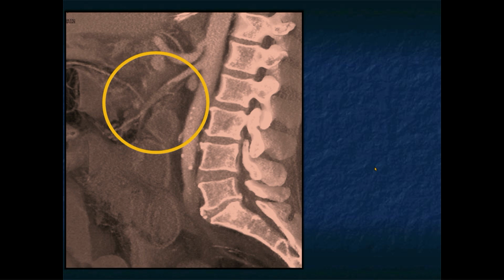When you look at the sagittal view, it's a great example because there's the celiac, which looks good. There's the SMA for about 4 centimeters. The SMA looks great, right? There's minimal plaque in the aorta. There's no plaque at the origin of the SMA. And this was read initially as negative because the person reading looked at the axial images. But you can see the patient has occlusion of the SMA.